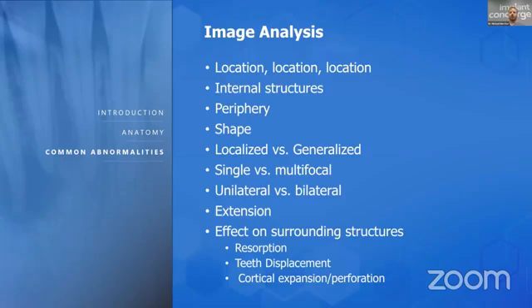And this is directly related to looking at the TMJ because, again, we can't see the soft tissue. You can have a soft tissue density, but you can't see the capsule. You can't see the ligaments, but you can see what changes are happening to the osseous structures that's going to make you now consider that there's something a little bit more severe.